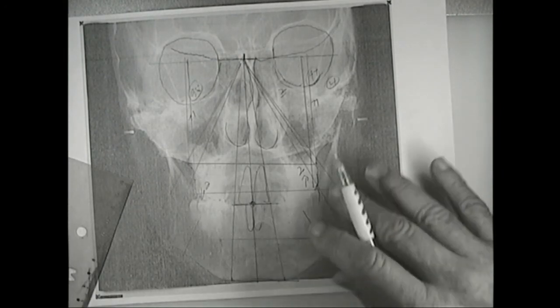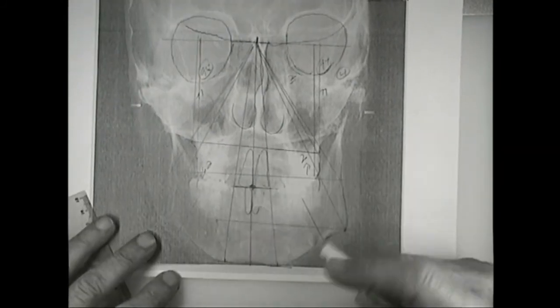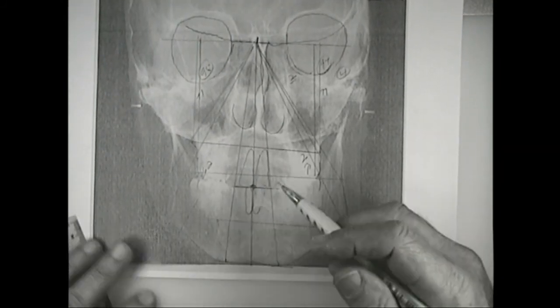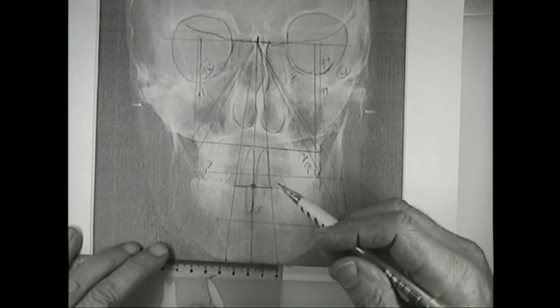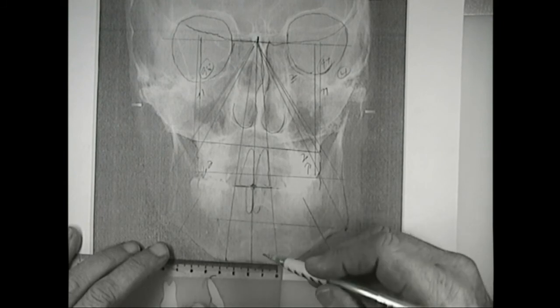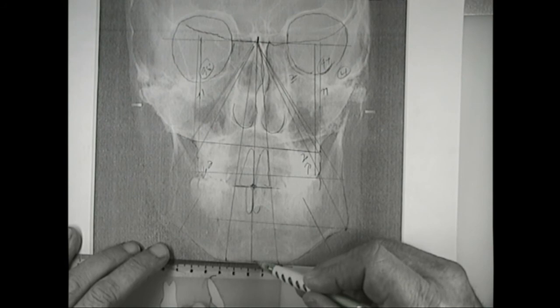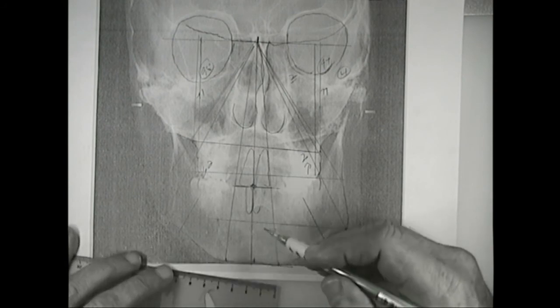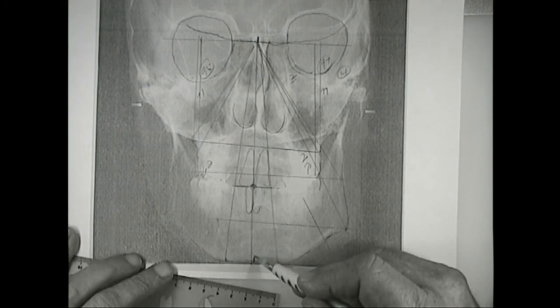And the important thing for me here, you'll see here at the bottom, I can measure the difference, this is 36, it's 15, it's 16, there, that's the middle.